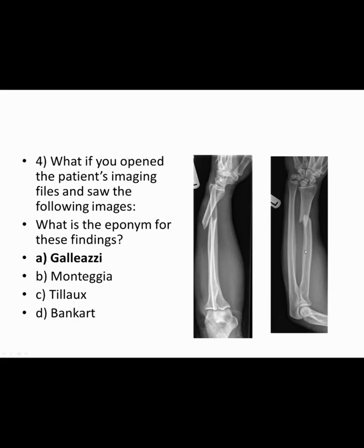So as we spoke about, if we're assessing for abnormal alignment, we notice the distal radial ulnar joint is not in appropriate articulation. Normally the ulna is sitting against the sigmoid notch of the distal radius, so the fact that this is extending beyond leads us to believe that there is a lack of appropriate alignment.